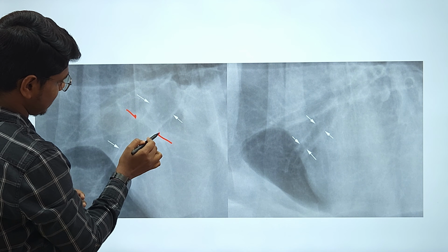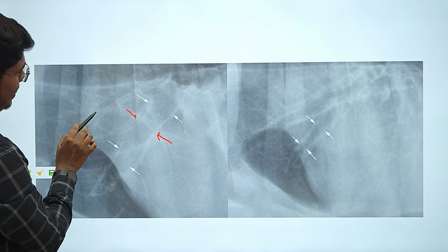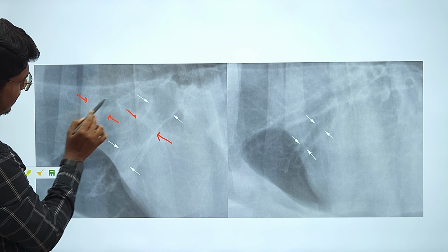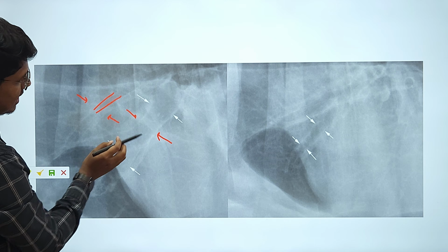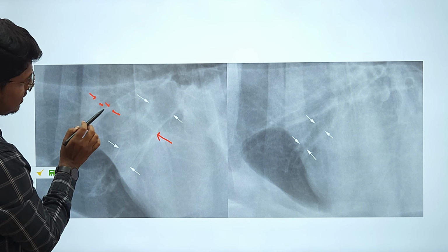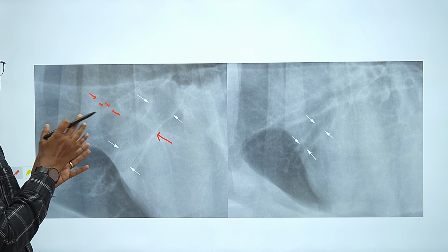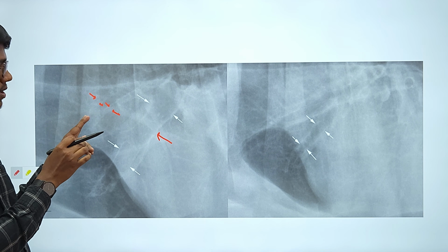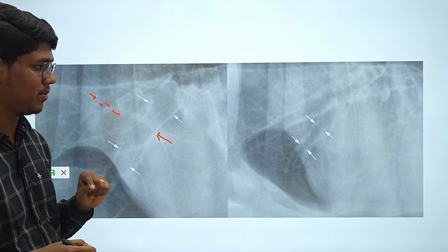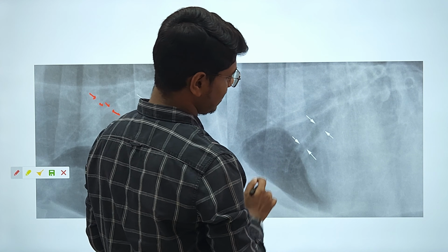You can see the wall thickness. You see here these pulmonary vessels. This is the cranial pulmonary artery, cranial pulmonary vein. You can misdiagnose this one as a tram line, but the vessel wall is clearly defined. In this particular position I told you vessels are present, so you should not misdiagnose this one as a tram line.